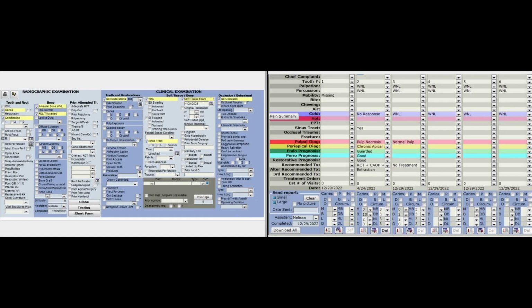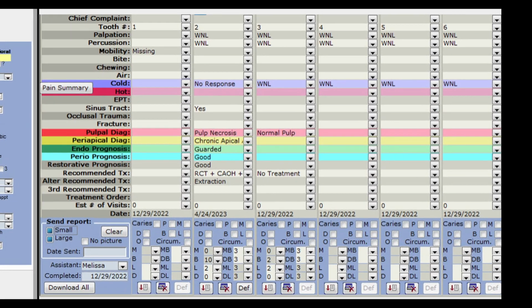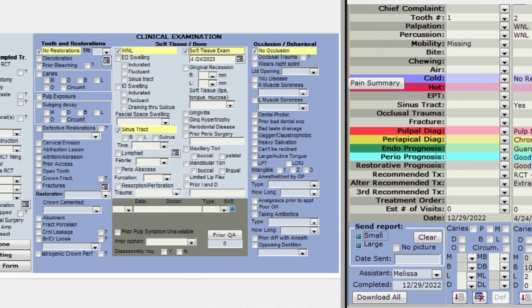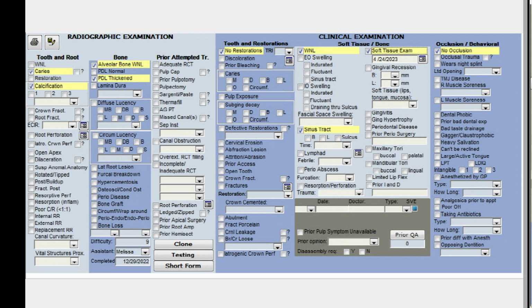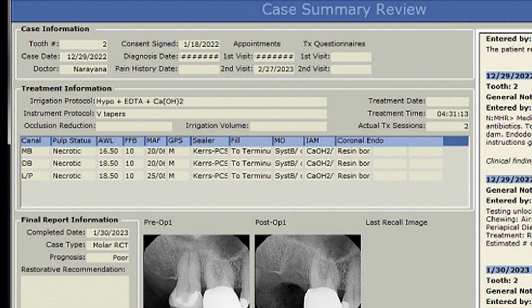This is Pushpak's tooth, and these are his diagnosis and MTI forms for the tooth. You can see that he indicated the pulp was necrotic, and although asymptomatic, it was non-responsive to stimuli. The diagnosis page indicates there was a sinus tract and only a thickened PDL. And when he went into the tooth, he did note that it was necrotic, and you can see from his notes, he used sodium hypochlorite, EDTA, and calcium hydroxide.